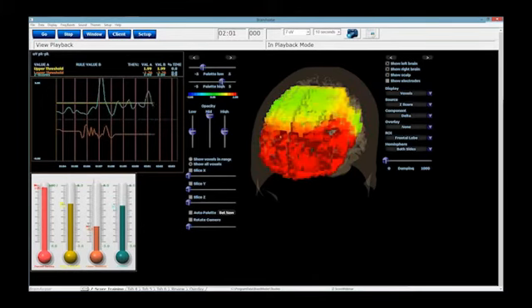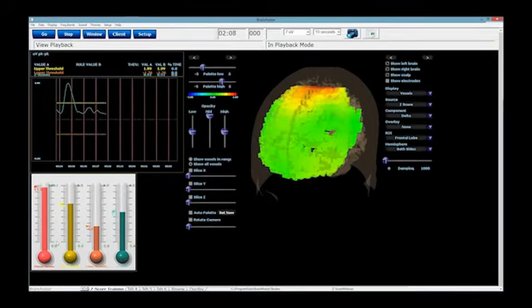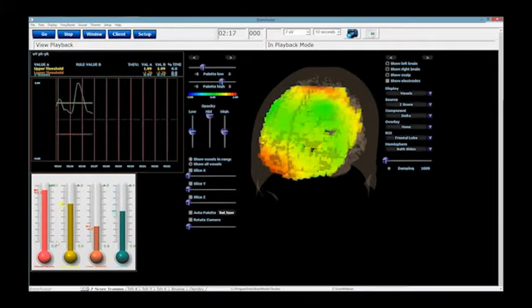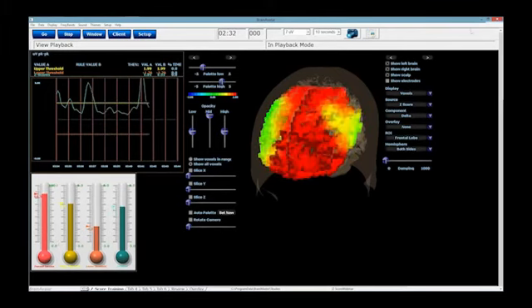Now, I'm going to do one other thing because I actually messed up on this protocol that's out there, and I'm going to have to fix this at one point in time. There we go. And we still have our % success. So basically what the % success is measuring on this one is when the actual Z-score itself is within that upper and lower range that we're looking at. It's going to, of course, basically be golden. It's going to reward with a MIDI tone, and it's going to reward on your multimedia player, and it's going to reward with your flash player, and that's how it's going to work. So that's the basic nutshell of this one right here.